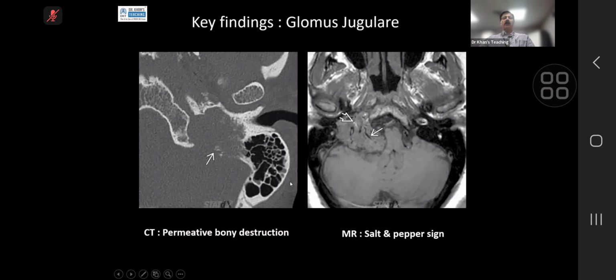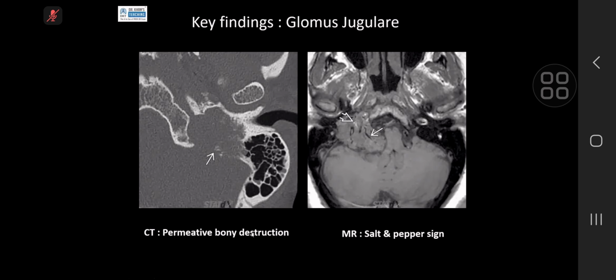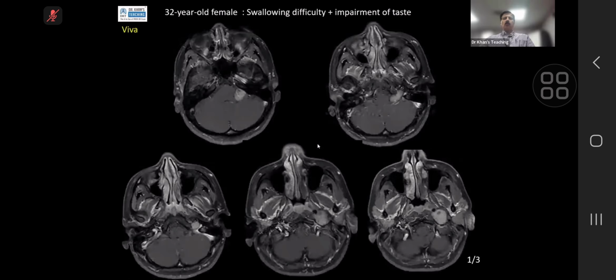Okay, thank you, candidate 3. Is candidate 4 with us? Hi. Yeah. Okay. So this one is a mass in the same location. This is an MR scan. This is a fat saturated T1 weighted sequence. You can see something here, something here, something here, something here. Can you describe it? What is your differential?